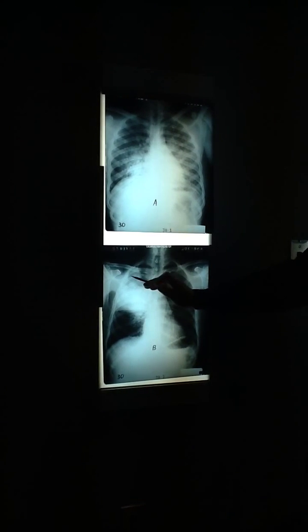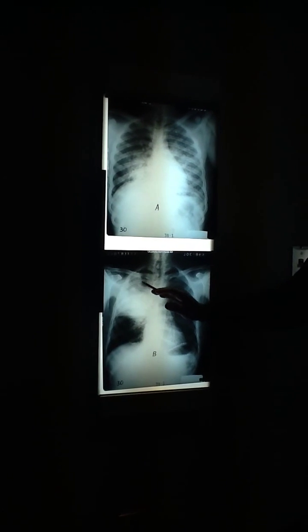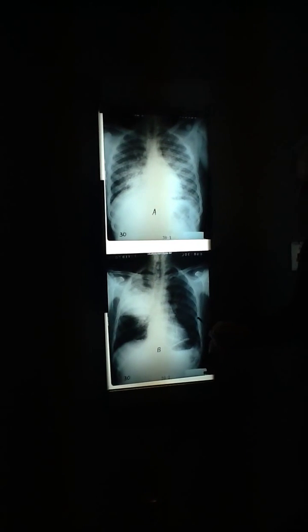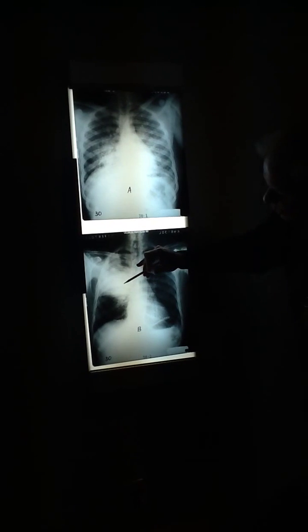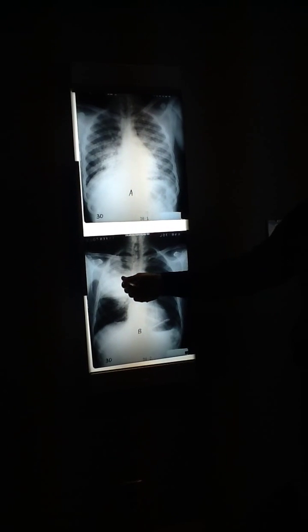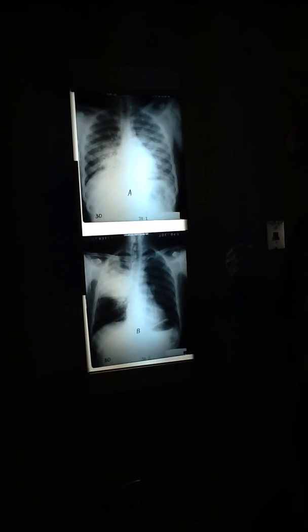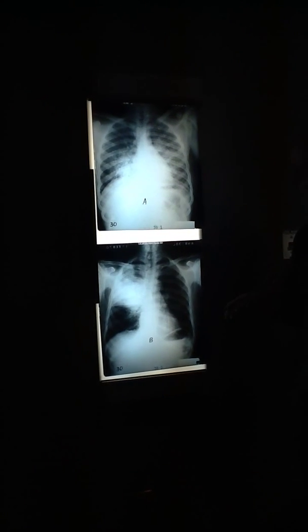You see how the transition is a fuzzy transition? Well defined, poorly defined, because there's no fissure up here. There's no fissure separating 1 and 3 or 1 and 2, is there? No. Also, if you look very closely, can you see the little faint branching tubular lucencies in there? That's because the bronchi have air in them, which is called an air bronchogram sign. It just means that there wasn't enough canals of Lambert involvement to fill up the airways also.